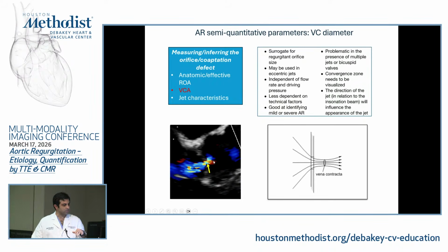So this area is black because this column of blood is directly perpendicular to the ultrasound beam, so it doesn't show a velocity because the number from the equation is 0. Does that make sense? So watch out for this kind of double head for aortic regurg. And we've done some work recently on trying to measure this to get an easy and cheap way of measuring PISA and flow convergence as opposed to doing the full PISA acquisition.